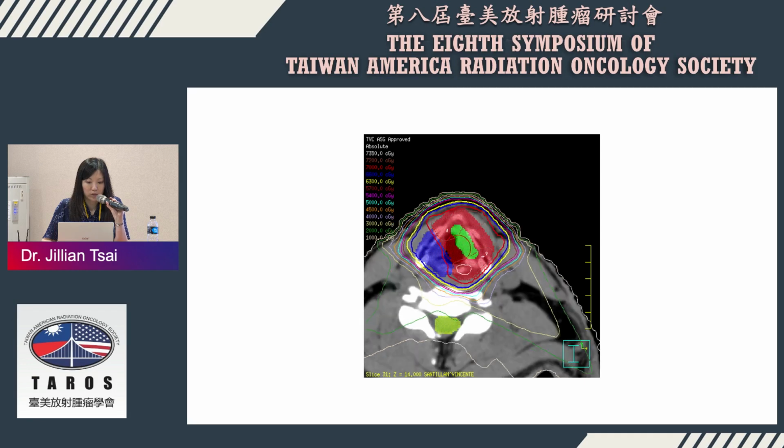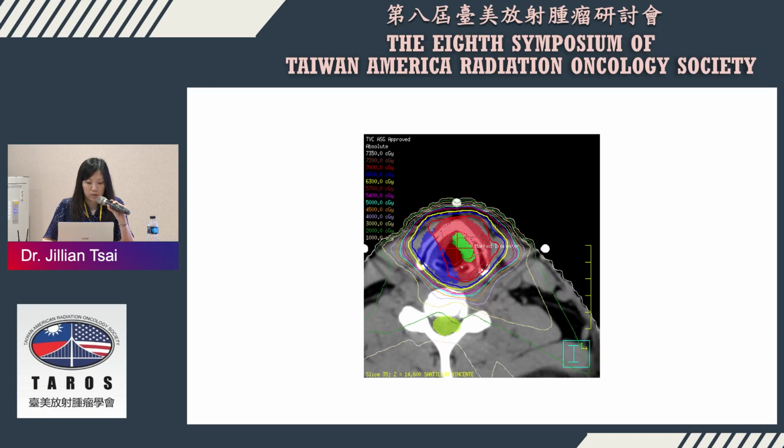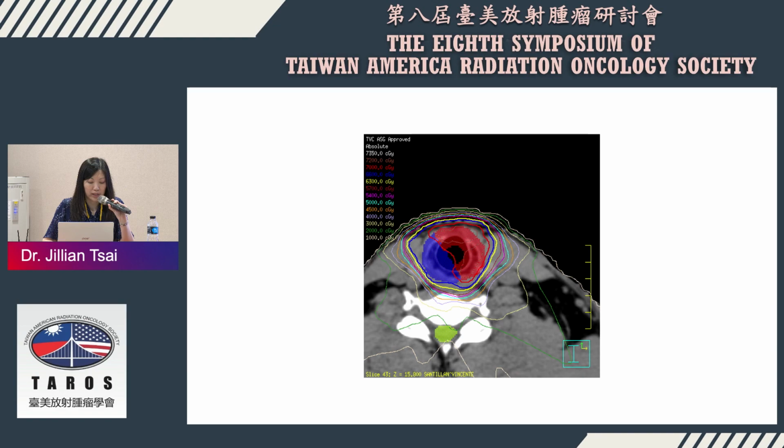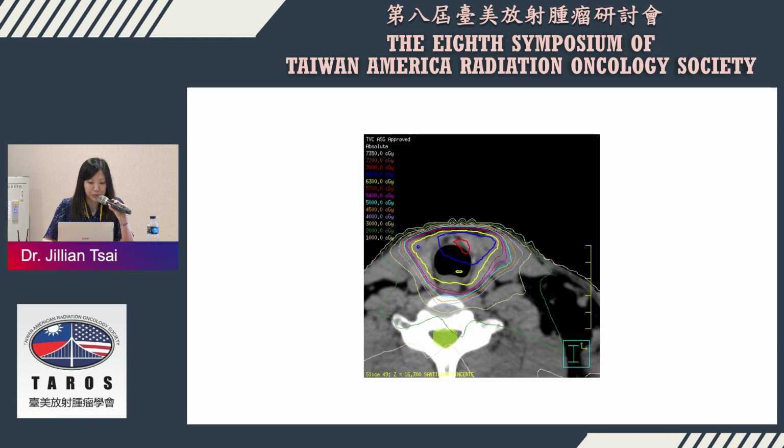So that's one of the approaches. The green is the GTV contour. If you use this approach, you at least need to do a daily KV or even daily cone beam, depending on your margin. So that's one way of doing the very simple, straightforward larynx case.